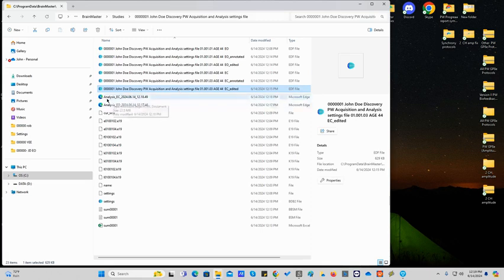And what about these two? The analysis eyes closed and the analysis eyes open. These are the two files that will be read by the PW wizard for BrainAvatar. These are the ones that will be used to create brain maps and protocols and client reports, etc. So we have finished the first process. We can now begin at any time to open up the PW wizard for BrainMaster and to begin the process of creating protocols. So that ends this first video.